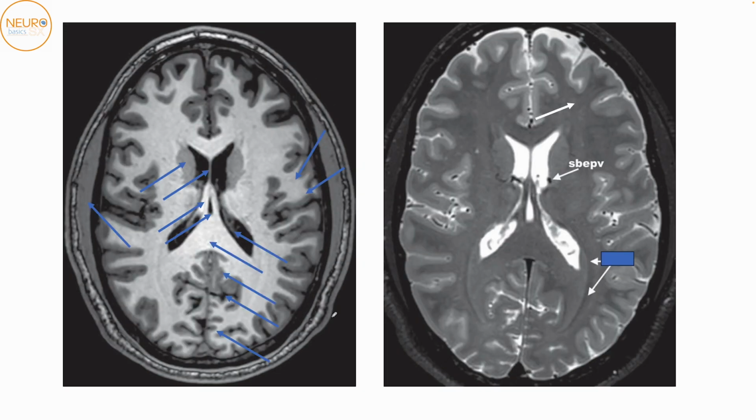Okay, so coming to one more cut inferiorly. There are a few important things to pick up on this slide. We can see that the lateral ventricle is becoming a little bit more clearly demarcated. We're able to see this structure, which is the choroid plexus within the lateral ventricle. You have the body of the lateral ventricle, you have the frontal horn of the lateral ventricle, and as we've discussed, we have the gray matter lying next to the lateral ventricle. This is the caudate nucleus.